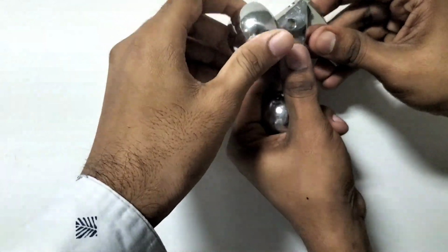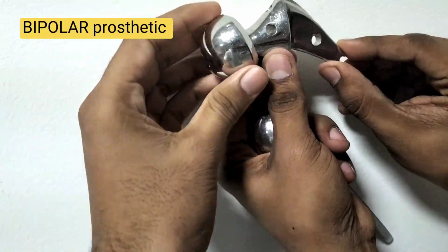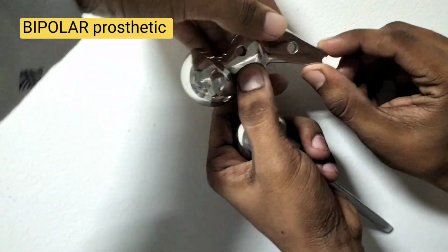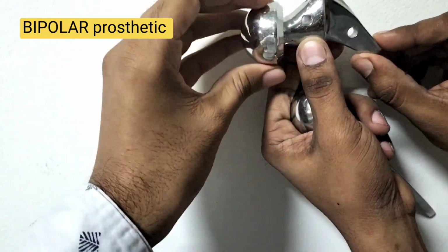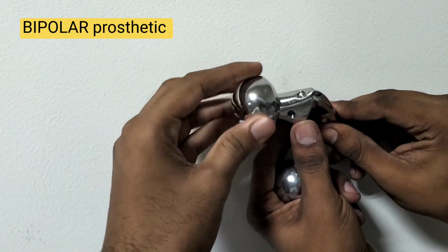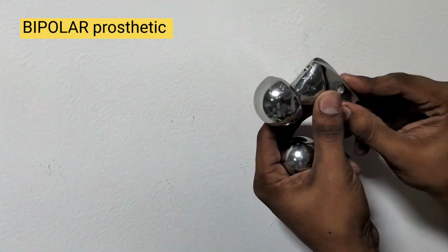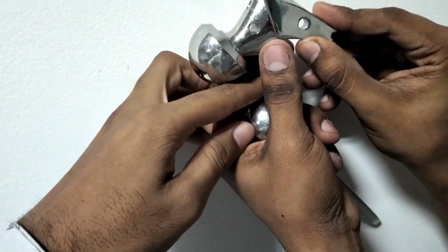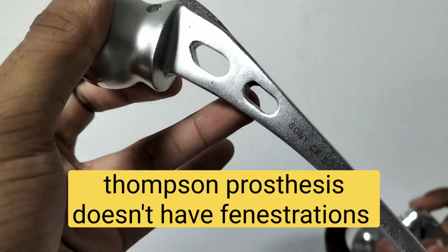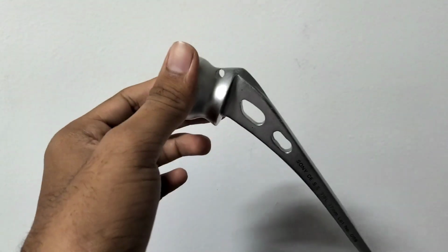There is one more called bipolar. Bipolar means it allows movement at two ends, here at the acetabulum also, and at the shaft neck of the femur also. That's why it is bipolar. Here you can see this is a bipolar prosthesis. And there is one more, that is Thompson. Thompson is different from Austin-Moore as it doesn't have any kind of fenestration like this. If there are two holes meaning fenestration, this is Austin-Moore.